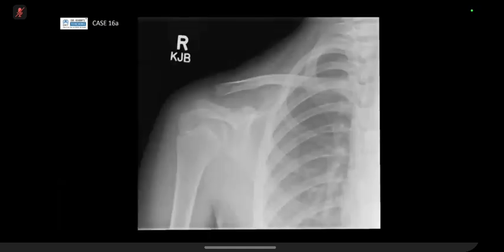Yeah, well done. So going back to the first one, you can see that there's actually expansion of the medial clavicle. You're right, there is no significant bony destruction, but what you have here is periosteal reaction along the medial edge, just underneath here, and possibly along the top. This is smooth periosteal reaction, suggesting this is a fairly chronic process.